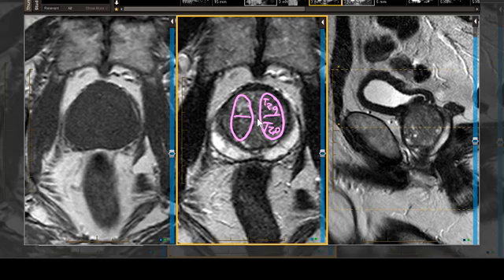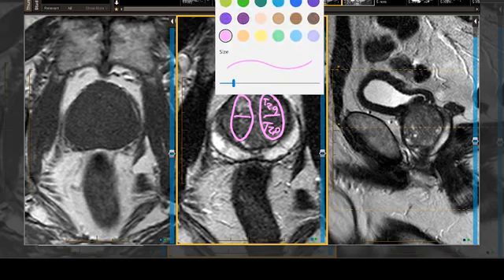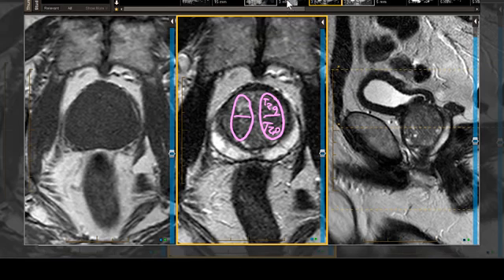Urethra is going to be in the middle with the periurethral plexus. We'll draw it in just for giggles for now. We'll say it's right about here. Then in the front, we've got a lentiform or arcuate-shaped structure that's pretty dark. We'll give it another color. Let's give it yellow. And we're going to have the anterior fibromuscular stroma, or anterior stroma, also known as the AS region. So we're going to have right AS and left AS, and they do meet in the midline.